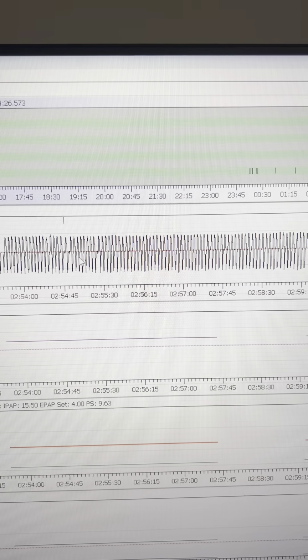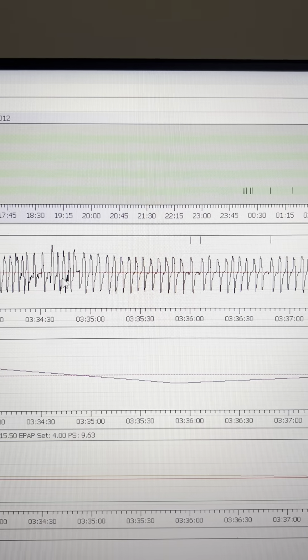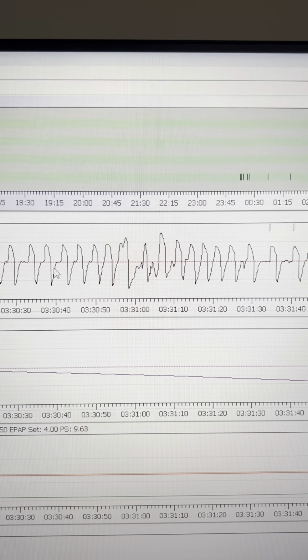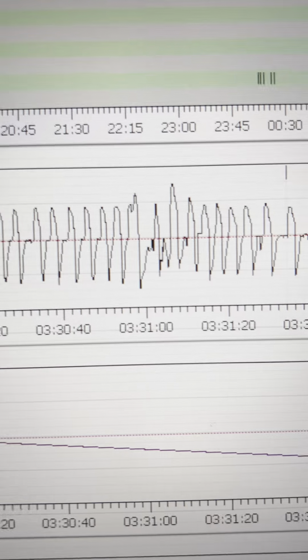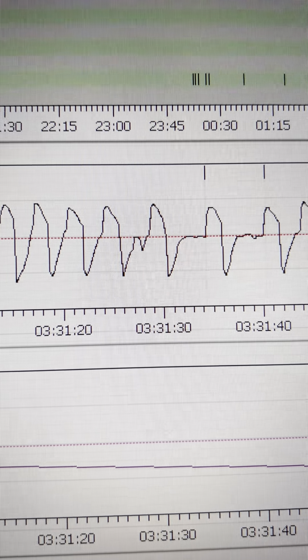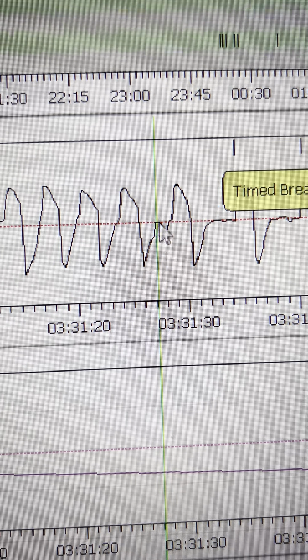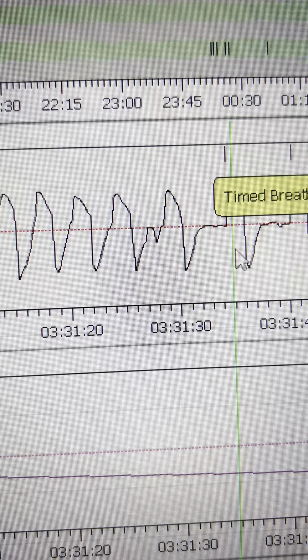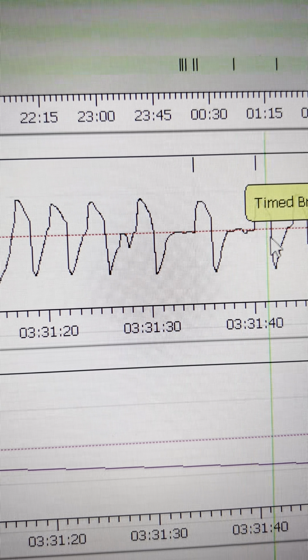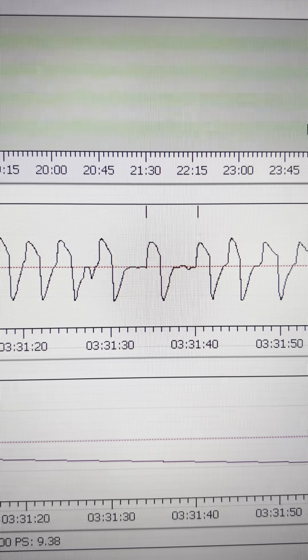This is deep sleep again, which you can see. And then here it enters REM sleep again, I'm guessing. So, wait, no, this is just instability from the recovery breath that happens. You see the small apnea that we talked about earlier again. See here, can breathe in, out, sharp, in. Here it collapses early. Here you can see that same pattern, but it only went in a little bit. And so forth.